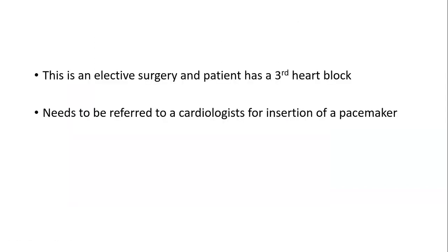Okay. So as you said, this is elective surgery with complete heart block, and the patient needs to be referred to a cardiologist for insertion of a pacemaker.